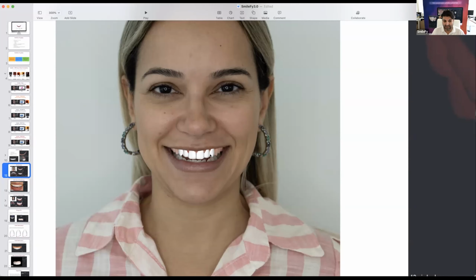That's a rendering for ceramics. You see the dentin, you see the enamel, everything is perfect. We can now add more and more textures and more materials like zirconia, composite, everything we want. That's a 3D design with all these textures and the smile. You can adjust the colors to the picture and have, before you print, a very realistic visualization of your 3D design in the mouth of the patient.